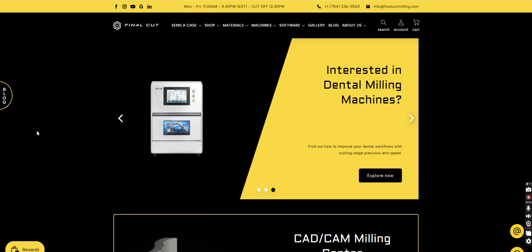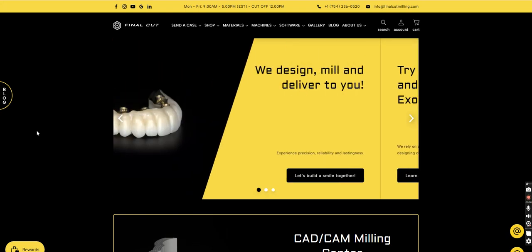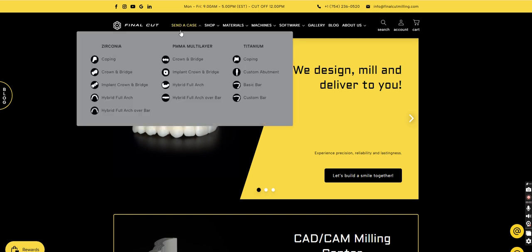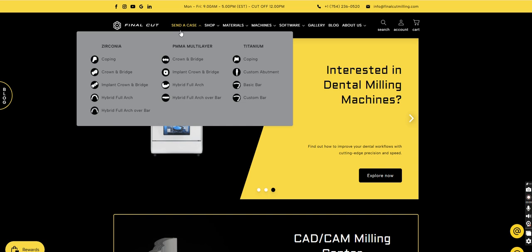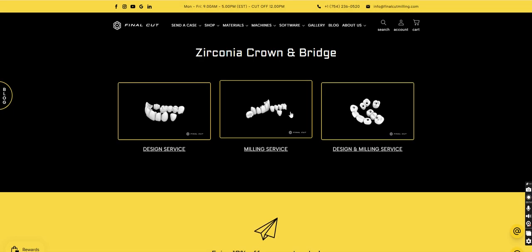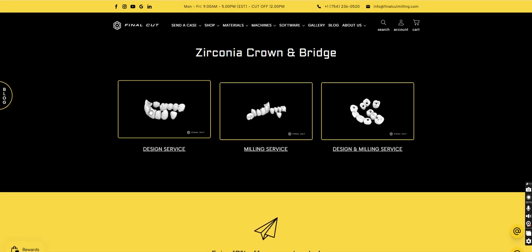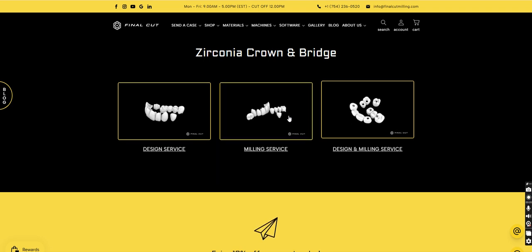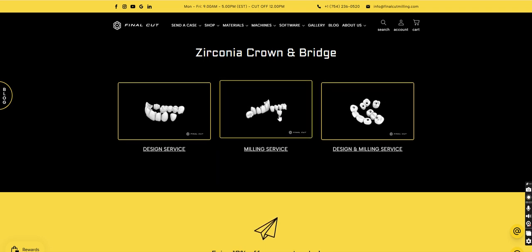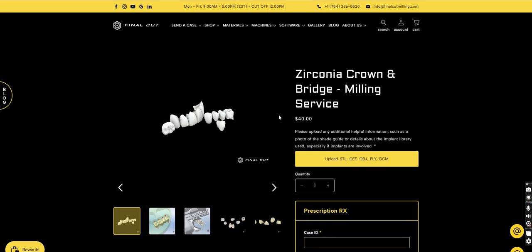Once the account has been created, we can proceed and send a case. So let's click on Send a Case. We have three types of material: zirconia, PMMA multilayer, titanium. Let's choose zirconia crown and bridge. Here we have three types of services: design service, milling service, design and milling service. Let's choose milling service. In this type of service, we want to upload the designed file ready to mill.